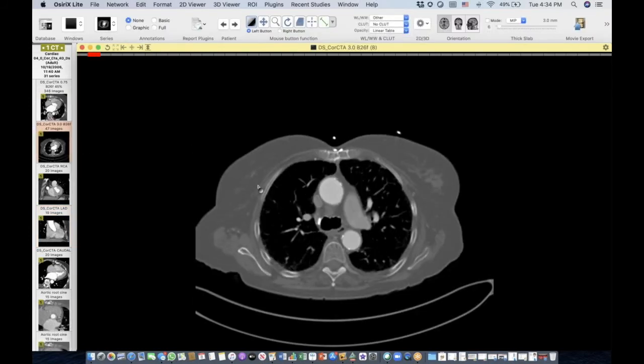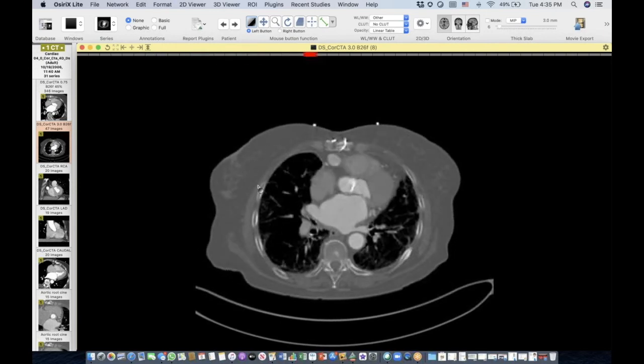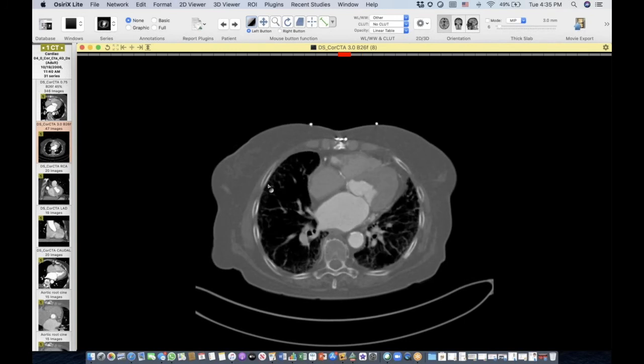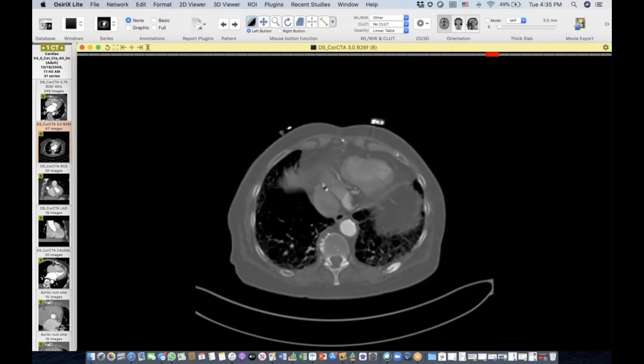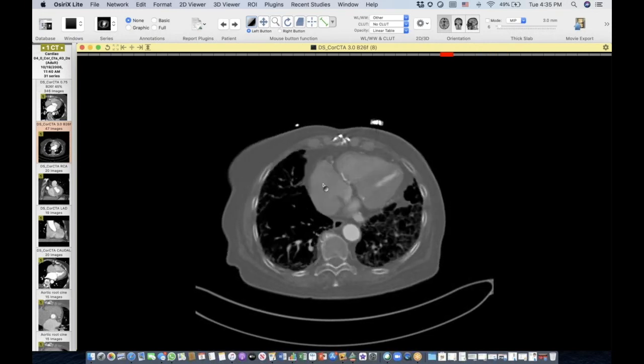These images here. So we were speculating that this may be related to the annuloplasty. You see right there, it's right at the edge. Here's the neck, like a pseudoaneurysm, a post-procedural pseudoaneurysm related to the valve repair that happened. So iatrogenic in nature.